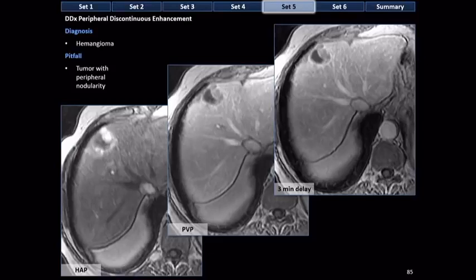This is actually a hepatocellular carcinoma that in the arterial phase superficially resembles a hemangioma. Notice, by the way, that what we're probably seeing here to some extent are nodules within nodules and maybe an area of necrosis, which is what's giving this HCC the appearance it has. Now, some of you might be thinking, well, this is a pretty easy case. I wouldn't get that one wrong.